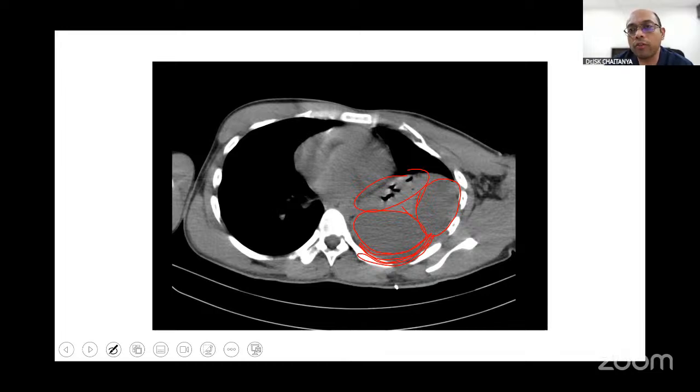So pleural effusion, how does it appear on an X-ray? On an X-ray, it shows up like an opacification, with blunting of the costophrenic angles. In CT, when we are doing an axial CT, instead of airspace, which is usually black, we see some hypodense material around the lung parenchyma, but within the rib cage. So this helps us in identifying pleural effusion.